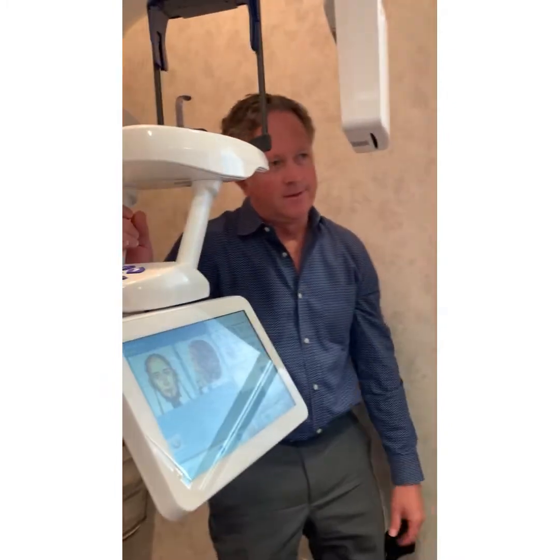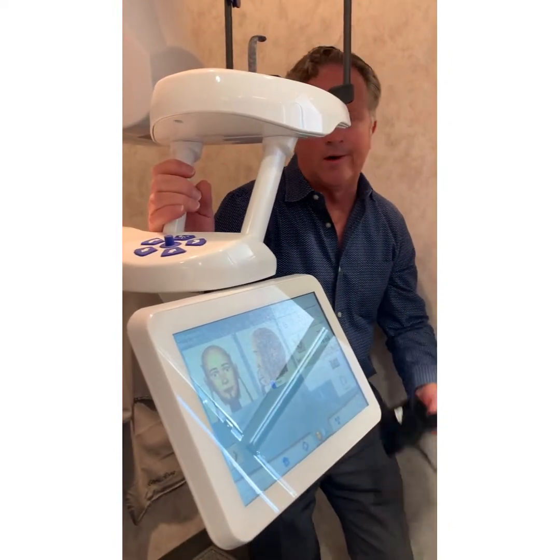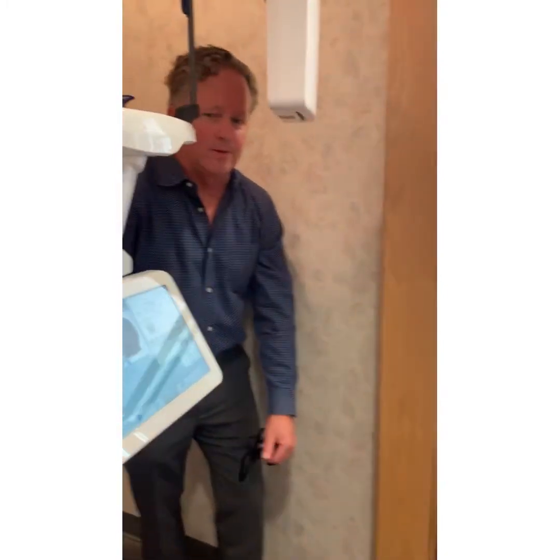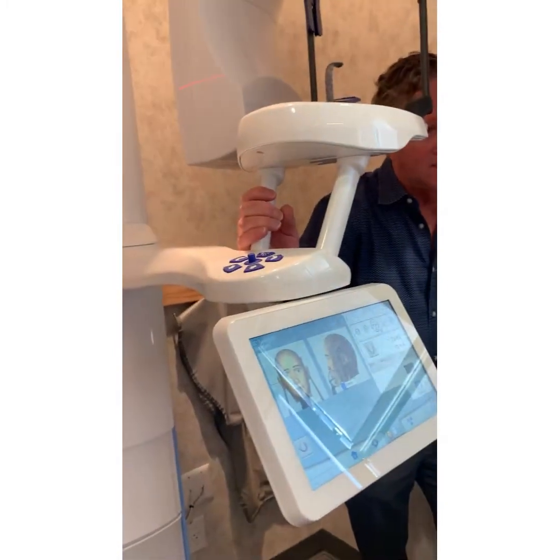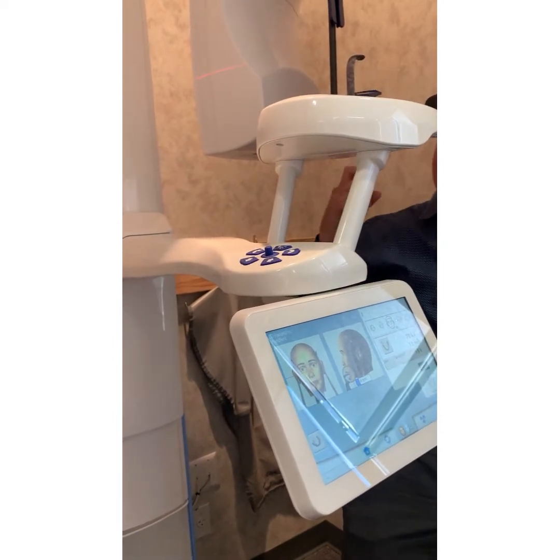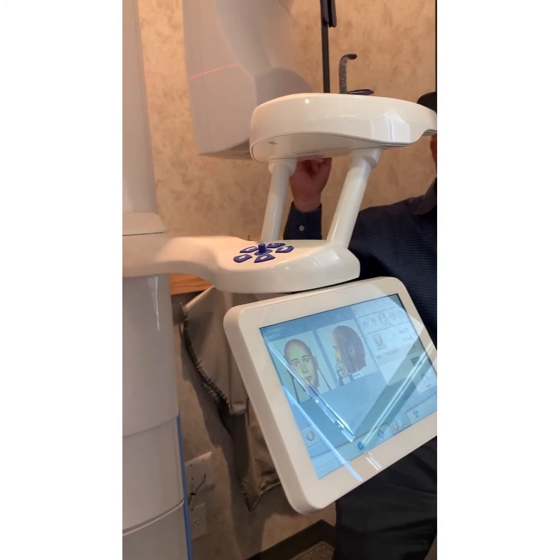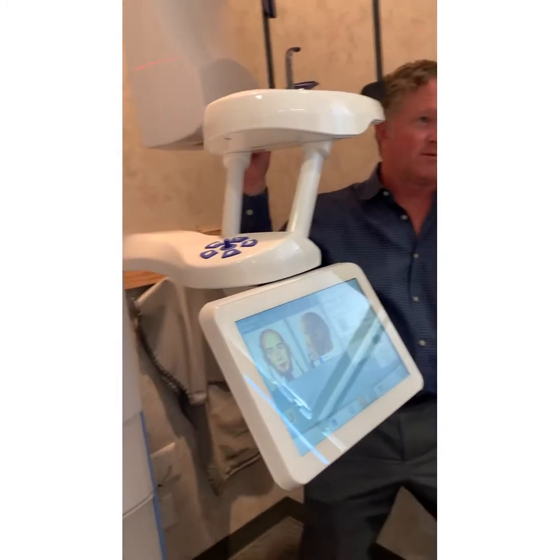Usually the issues that I see are where they didn't make the kid take his hoodie off. Oh yeah, the hoodie is just another thing. This guy's finally retired, but I used to have an argument. Now with the technology we have, this fixes this. But he would argue with me that every time he had a woman with big hair in the machine, like a bun or something, that somehow it would impede this moving around and mess up the scan. This thing pushes like 75 pounds. Big hair is not going to keep this from going around.